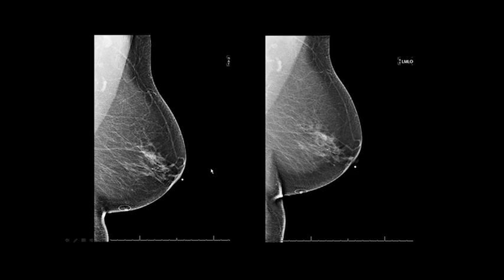Compared to a different technologist, same patient, you can see it's wide superior to the convex border. You meet 45 degrees. The nipple's in profile. It's sharper. The contrast is prettier. And the IMF does not have an air gap here. It's smoothed out by the technologist where they bring their finger underneath and smooth it out. These folds here, you can't see. It's not that the technologist is always being lazy. You can't see it. It's underneath.